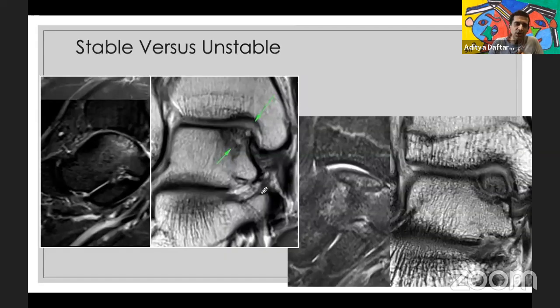And when you have an osteochondral lesion, obviously the reason you're looking at this is to determine whether that osteochondral lesion is stable or unstable. So the first thing you want to look at usually is the status of the overlying articular cartilage. Now you can see the cartilage really nicely as this gray area that is between these two bones, between these two red lines, this gray area, that is articular cartilage. And you can see here anteriorly, this bright area is the articular cartilage. And as you come more posteriorly, you can see here that there's almost no articular cartilage in this region. So we can tell the status of the overlying articular cartilage of an osteochondral lesion.